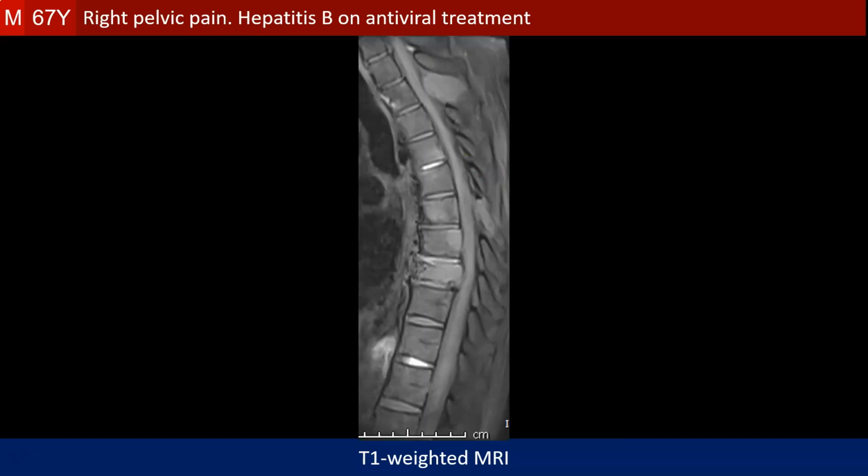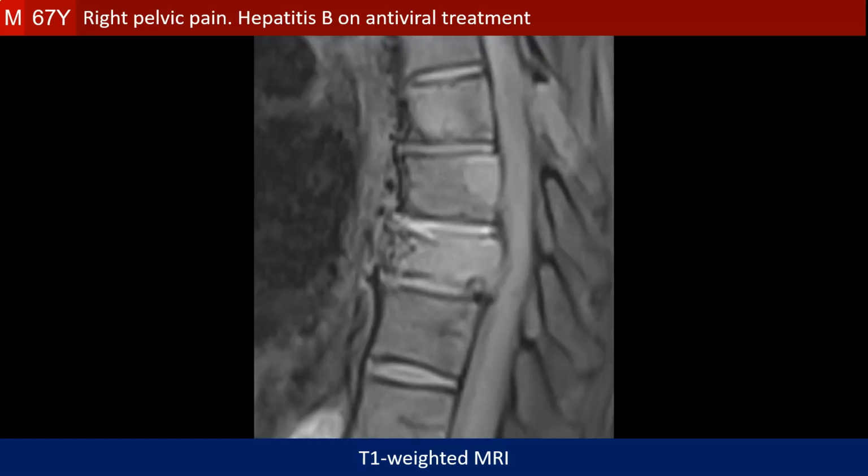Hepatocellular carcinoma is one of the mimickers of the multiple myeloma as far as the signal intensity in relation to the spinal cord is concerned, because the metastases contain hepatocytes, and the hepatocytes share with the mother hepatocytes in the liver the feature of their high signal intensity on T1-weighted images. The reason why we may think here of hepatocellular carcinoma metastasis more than multiple myeloma is the involvement of the pedicles. The heavy involvement of the pedicles is more in favor of metastasis than multiple myeloma.